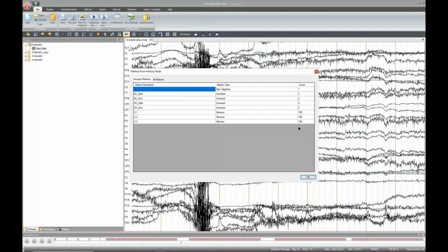To start pre-processing, the first thing I would like to do is to rename our positive picture marker from S1 to positive. This will make it easier for me to remember which is which every time, so more intuitive. And also, if I would like to share the data with someone else, they would also recognize more easily which kind of stimulus was being presented.